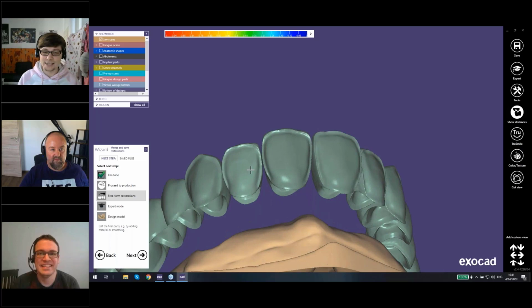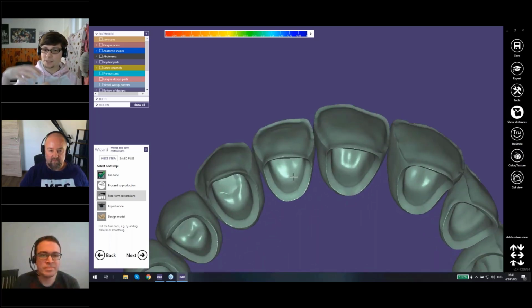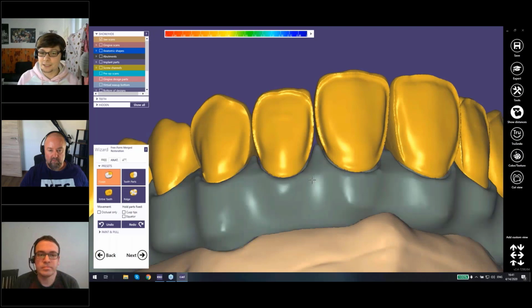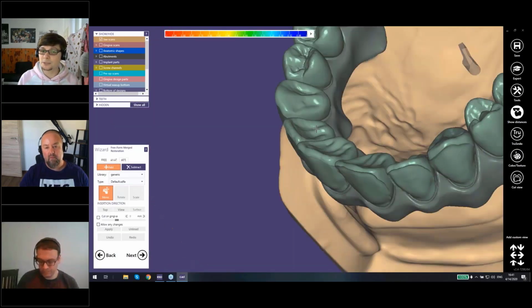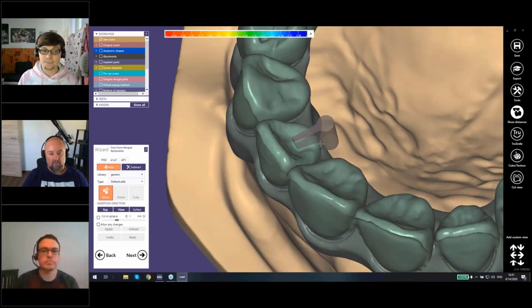Since the STL files of your crowns are now one singular piece, the bottom and the top side of the crown are merged together. So if you go to the Freeform Restorations now, you actually have the possibility, if you use your attachments, to create holes through the complete crown. If you do it in a step before, you cannot create a complete hole through the crown, only through the top of the crown, and then the minimum thickness will be applied again.